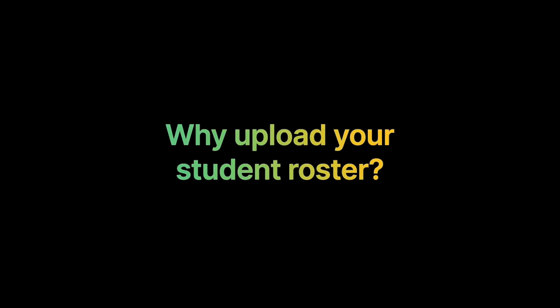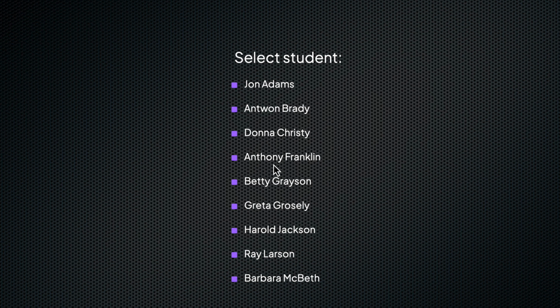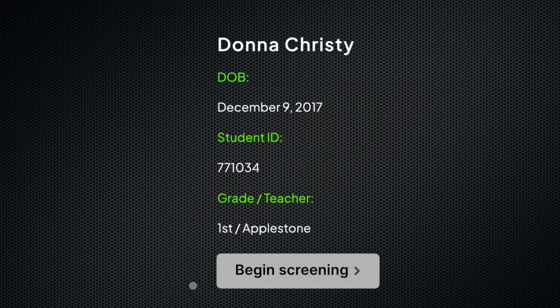While you can enter each student's information at the time of screening, it is much faster to have all the students preloaded into the system, allowing you to quickly select the student to be screened from a list and having the system enter the information on your behalf. The process of preloading the students can be broken down into 3 steps.